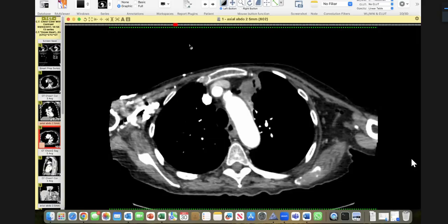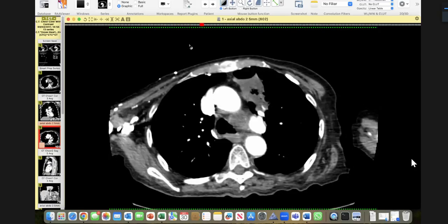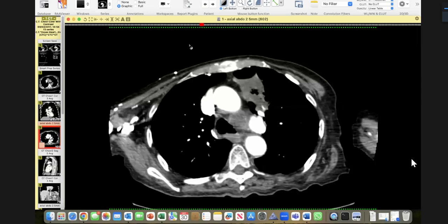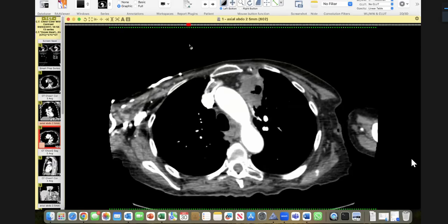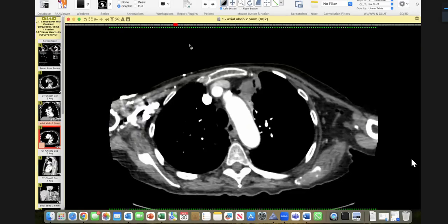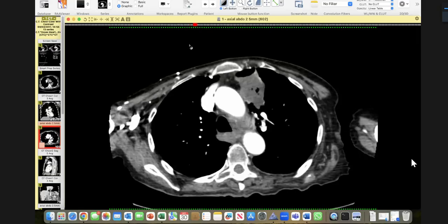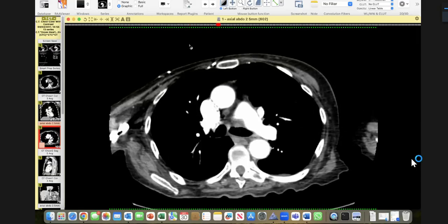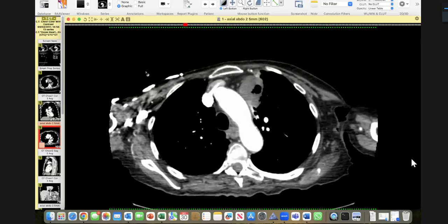Thank you for giving me that. I would have asked for the mediastinal window. So this is basically abutting the mediastinal pleura, showing extra-mediastinal invasion abutting the arch of the aorta. So this is likely a tumor that shows a cavitation, bronchogenic carcinoma. That is the next step. I assess for invasion to stage the tumor. So I can see that it's breaching the mediastinal pleura, abutting the aorta.